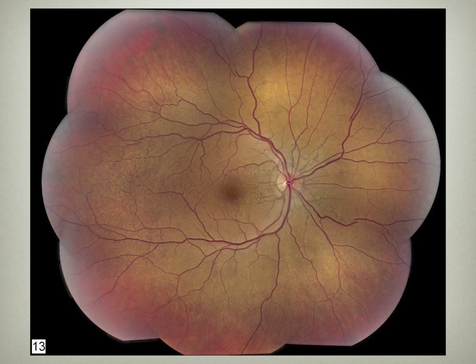This is a montage. So this patient has angioid streaks. That's what you were seeing emanating from the disc. And what do angioid streaks put you at risk for? Angioid streaks. Well, first of all, do you have a different detachment? Not retinal detachment. Do you know what kinds of disease entities will cause an angioid streak? The only thing that's coming to mind is pseudoxanthoma elasticum. That's exactly right, and that's probably what this patient has. You don't get the peau d'orange with other entities necessarily.